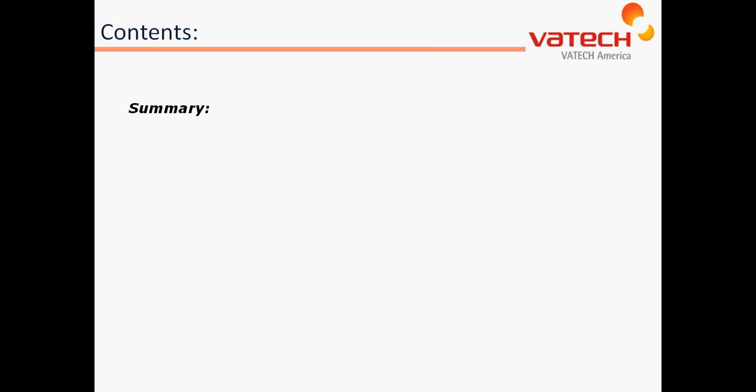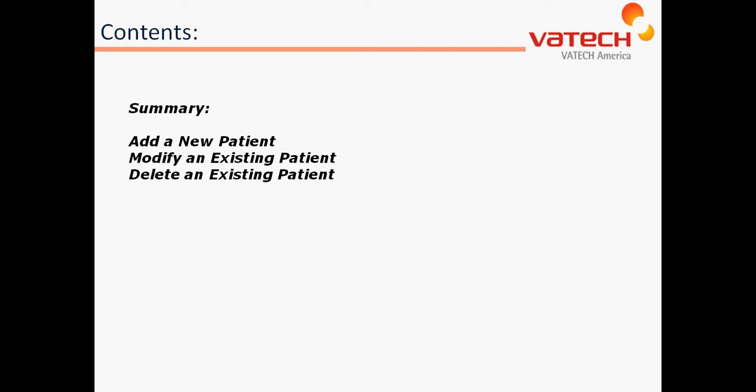This completes our patient add, edit, and delete tutorial. In summary, you should now be able to add a new patient, modify an existing patient, as well as delete an existing patient.